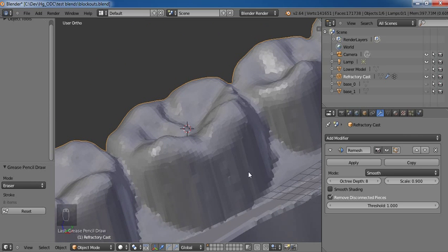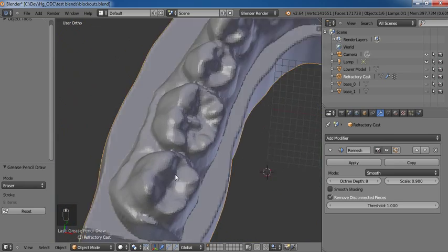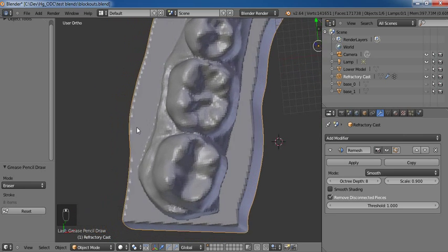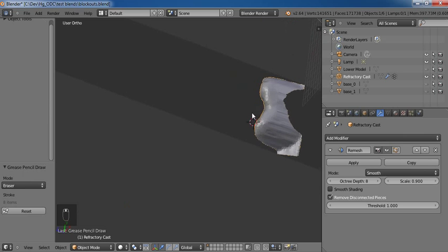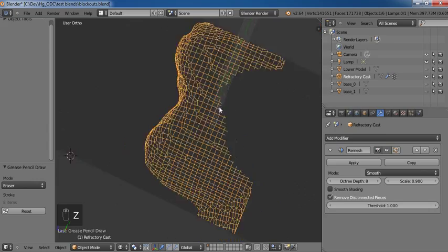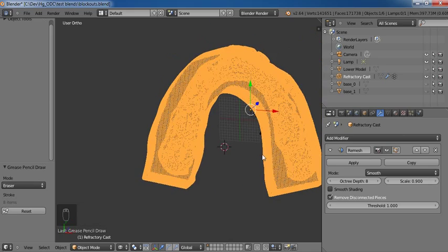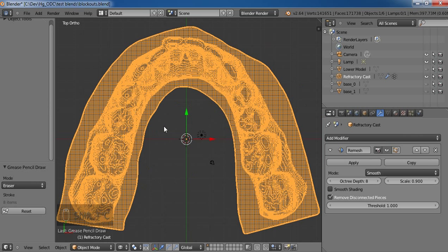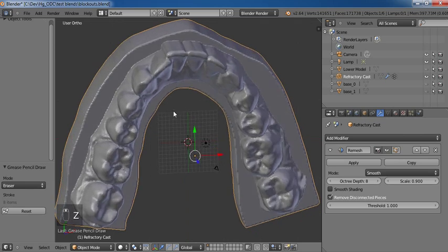Also, instead of just having straight lines up and down, you have a nice, kind of even mesh over that whole surface. This does come at the expense of a little bit of accuracy, but as far as the smoothness of your moving around and also how fast your computer is going to behave, this helps a lot. So depending on what you're after in terms of blockouts.